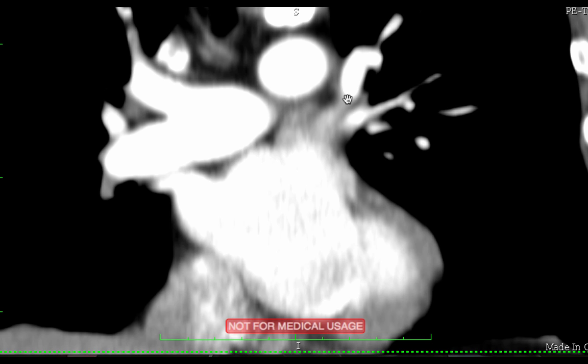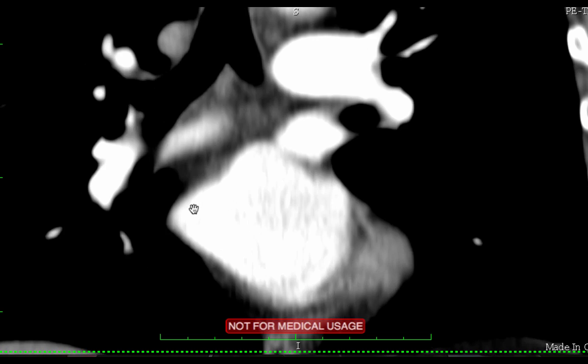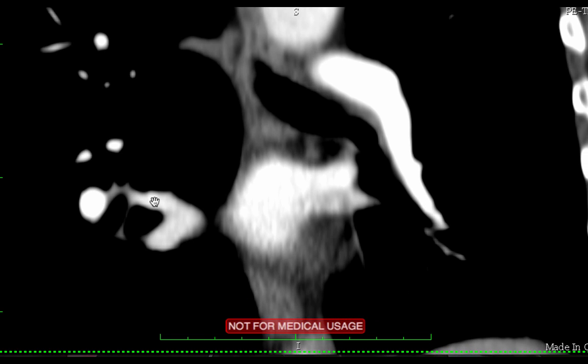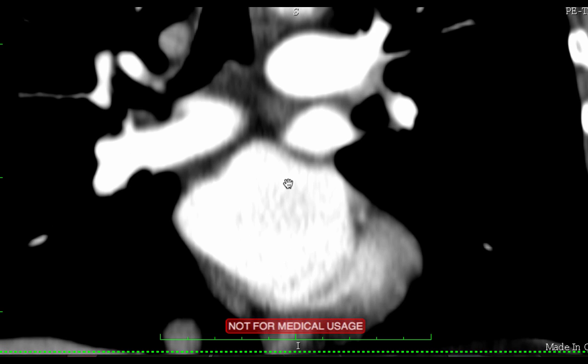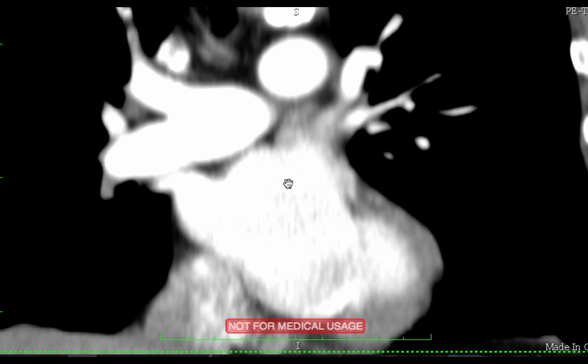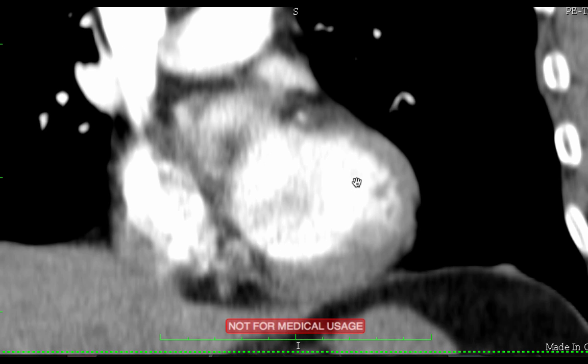These are pulmonary veins coming from the lungs into the left atrium on the left side, and over here they're coming into the left atrium on the right side. And so this is the left atrium, and that means that it's going to have to communicate with the left ventricle, and that's what it does. So this is left atrium, and this is left ventricle.